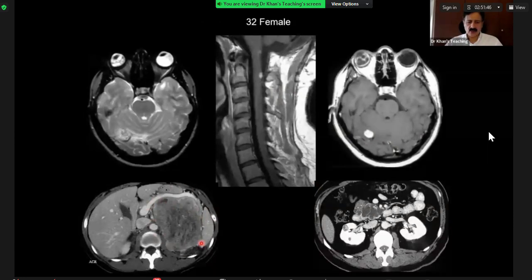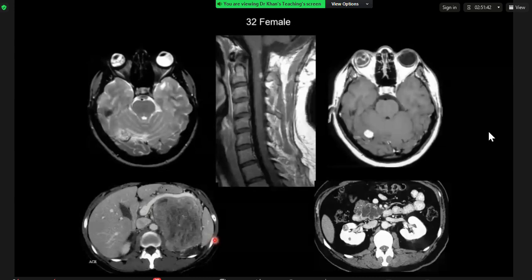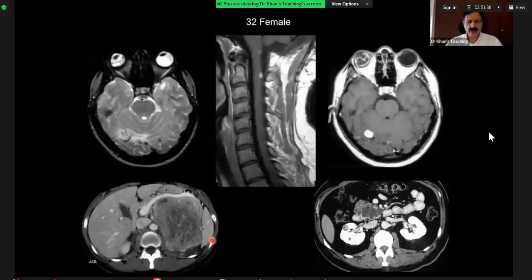What is this, candidate 2? This is a large, I think, renal cell cancer. Okay, so you are right, because you don't know the anatomy. I've just given you one slice, but actually this was a large adrenal lesion, which was a pheochromocytoma. And then you can see this cystic lesion in the pancreas, and this cystic lesion has got calcification, some lobular edge.